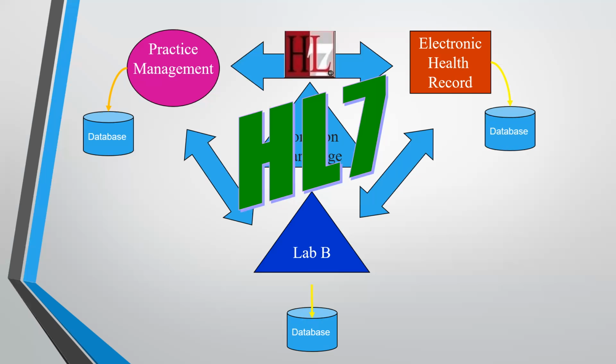Okay, so that is how HL7 has helped a lot in the past, and that is how HL7 came into play back in the 1980s.